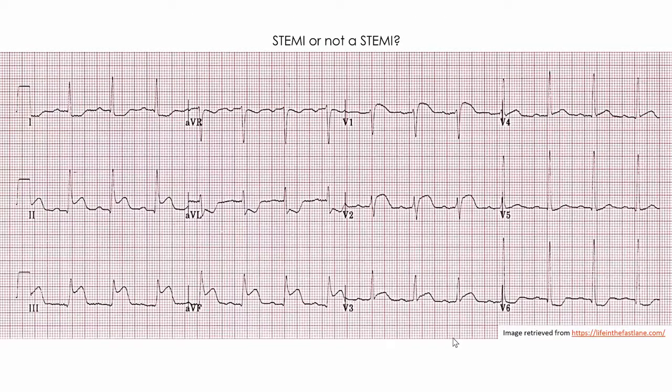Here's another example. Is this a STEMI or not a STEMI? I'll give you a moment to go through it, and then I'll talk it through.